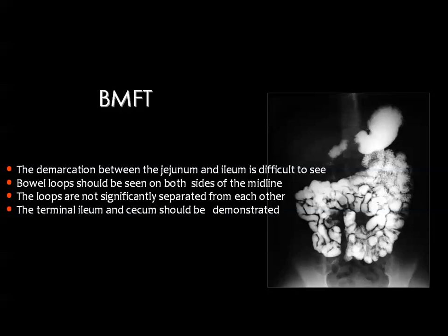small bowel, demonstrating the flow of barium through the different parts of the small intestine, including the jejunum and ileal loops, until we reach the region of the ileocecal junction. Then the examination is considered finished.